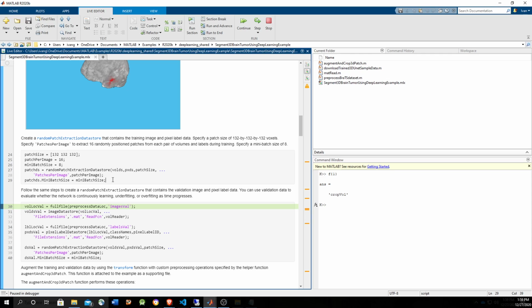That means that your neural network did overfitting. It's not generalizing well. So for that, you reserve some of the data for validation. When training, for each batch, the neural network is gonna update the weights, and at that point, it's gonna compare against the validation data and see how the precision is increasing over time.